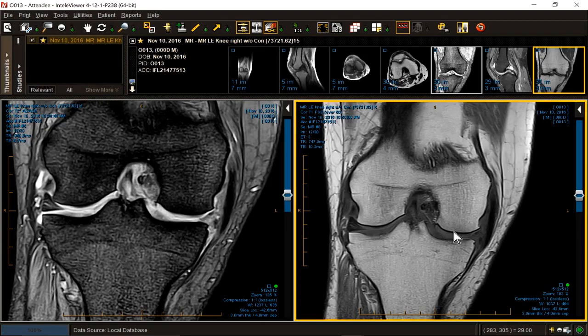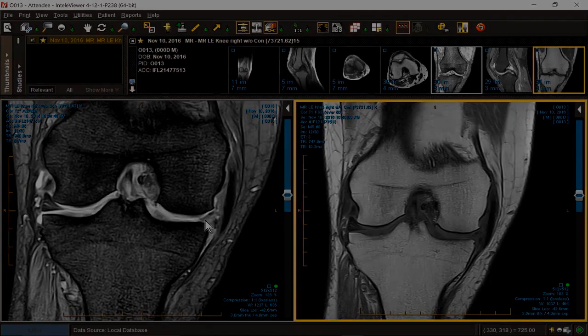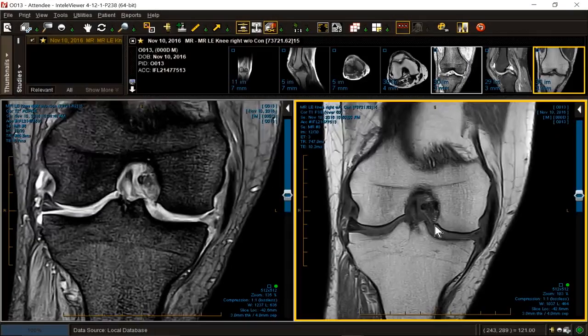That's not how it was made. What about the meniscus? The patient is not even standing up. Look where the meniscus is. The meniscus is extruded. It's not anchored. It's not tethered. So when they stand up, it squishes out like a piece of toothpaste from the tube. It's meniscal failure.